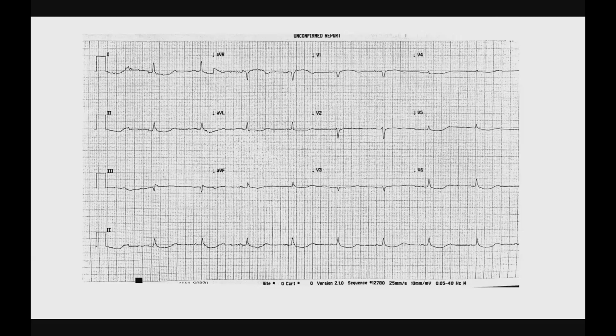There is an ST segment depression in I and aVL. Good. So you've got some ST segment depression, and kind of an odd-looking ST segment depression. Do you think anything special about this? It looks kind of different from the usual ST segment depression you see. Any thoughts?